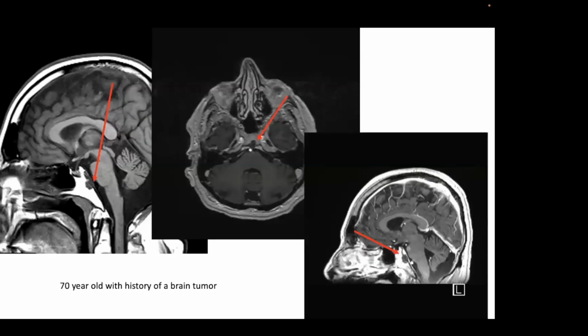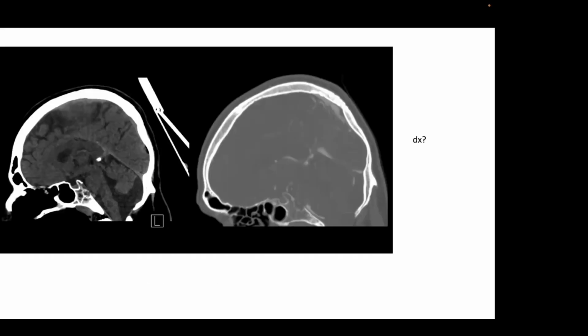So you're in the right category, but I want to show this to you. This is a disease which I can hardly pronounce the name. It's called ecchordosis physaliphora, and I always have to look that up to spell it, but these are benign notochord remnants. They do not grow over time.